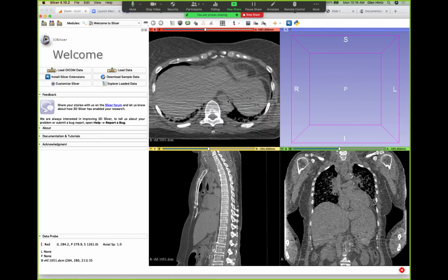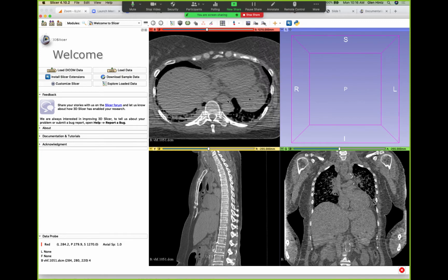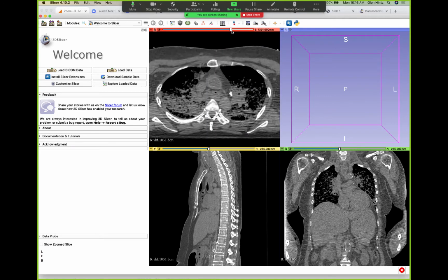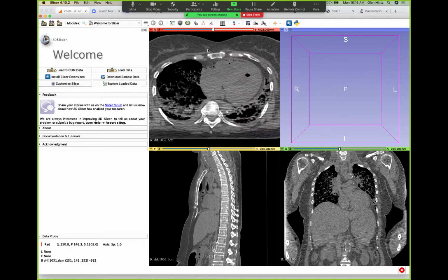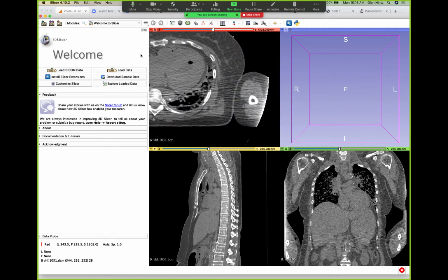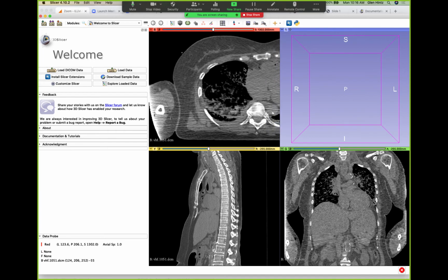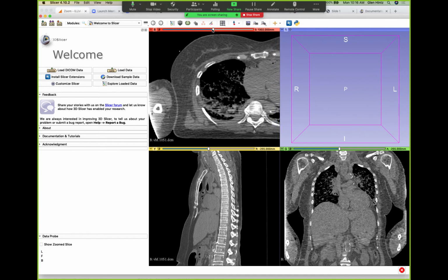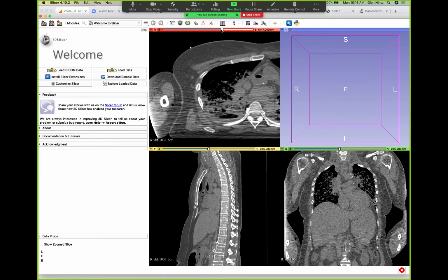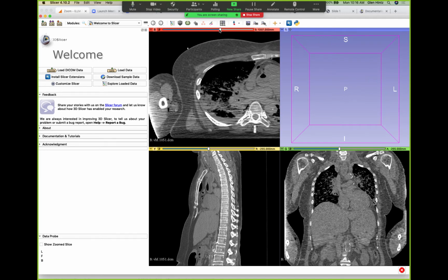The middle mouse, if you have a wheel on your mouse and you scroll it, it will go through the sections. Otherwise, you can use the slide bar up here. And if you push down on the middle mouse, it's going to pan or move you left to right. It doesn't really matter which shoulder you take, but you want to look for right about there, that level.